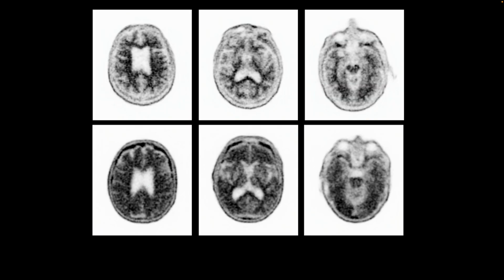All right, so changing gears again, we have two sets of images. One patient is here on the top and the other patient below. And these are images from an Amyvid PET CT. The scan on top at 3 different levels is showing uptake in the white matter only, and the gray-white differentiation is preserved, as we see here and here.